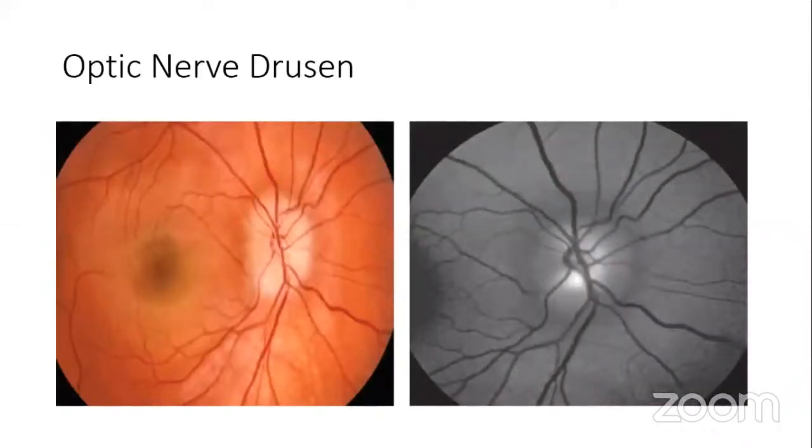This is an example. What the patient has here is optic nerve head drusen. It's one of the causes of pseudo-papilledema. You look and you see that the disc looks raised with indistinct margins, but if you look at the vessels around, you see that the vessels are well outlined. They don't look compressed, and the retinal nerve fiber layer around it is also normal. So it's a pseudo form.